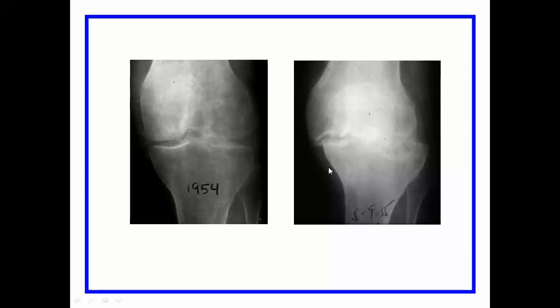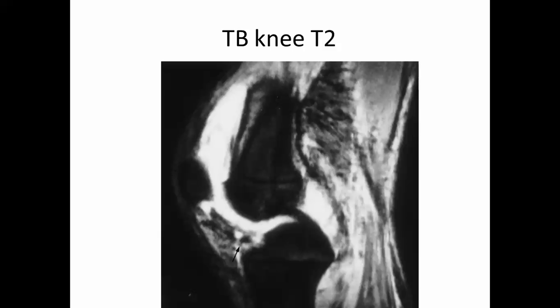Of course, the main feature, being chronic, is osteoporosis. So expect osteoporosis, cystic changes or destructive changes, and synovial thickening. And once synovial thickening occurs with fluid inside the joint, any deformity you can get, subluxations are common. Here, this is a synovium, markedly full of fluid, markedly irregular and serrated and thickened, and this involves the whole thing.